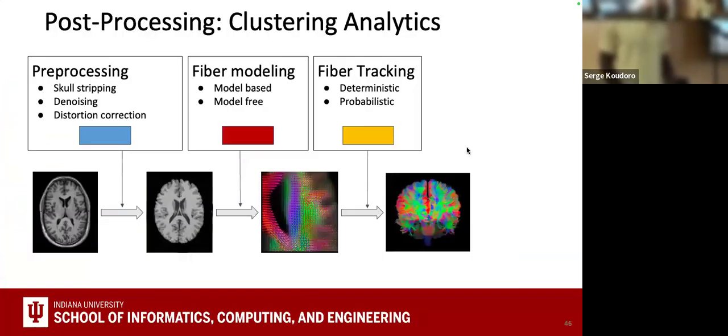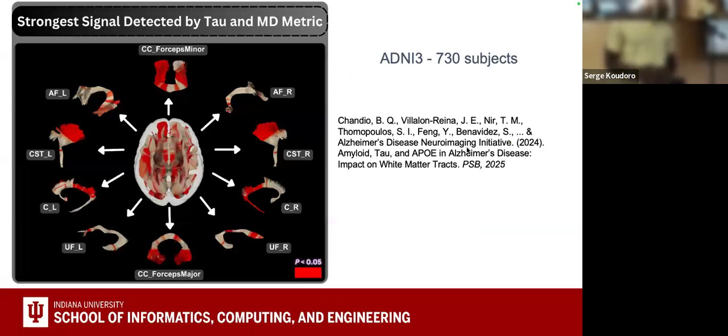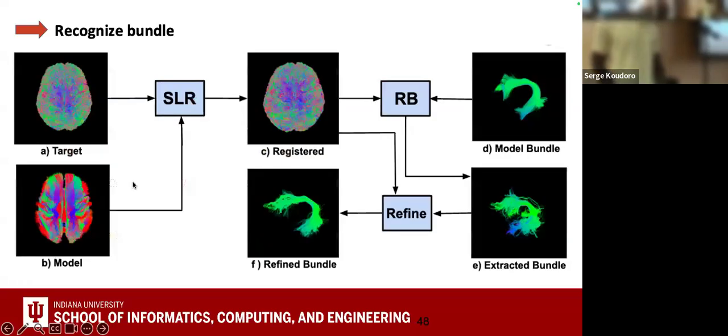Yeah. So now that we did the fiber tracking, it's time to tackle the post-processing part. And why do we need post-processing? Now that we have our full brain full of tracks, what we are trying to do, of course, is detect different parts of the brain, because all the disorders usually target one specific part of the brain, and we want to be able to detect every part of this brain and get some analytics of these different parts.